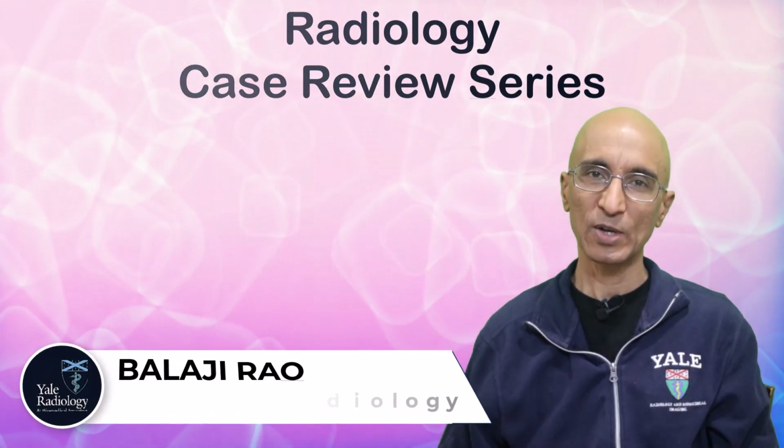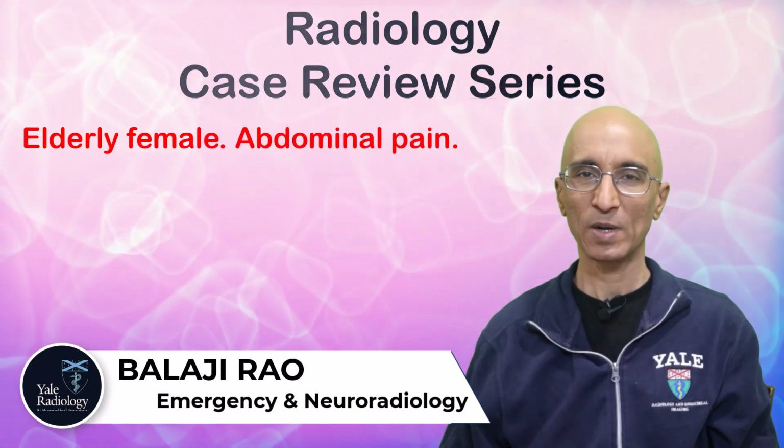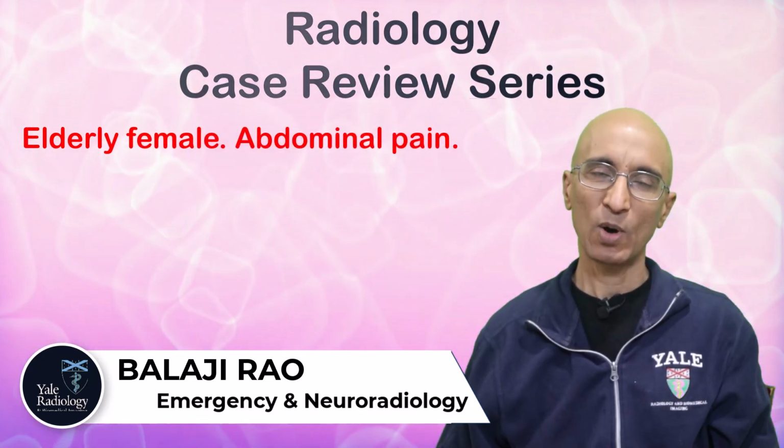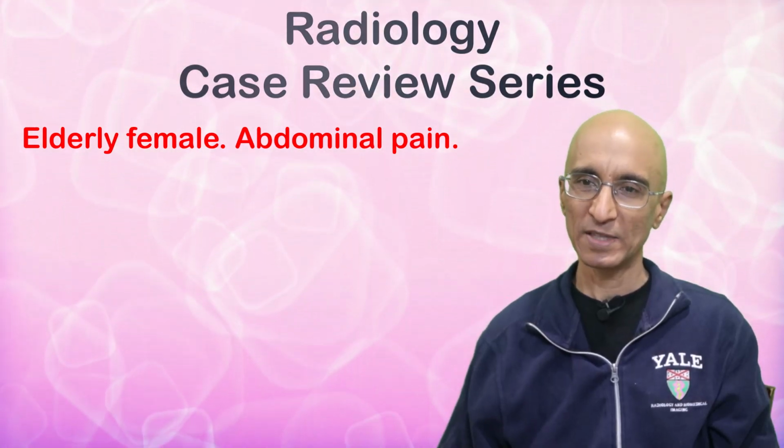In this video, we are going to look at images of an elderly female patient who presented to the emergency department with abdominal pain. The clinical team ordered a CT examination for further evaluation. Let's look at the CT images.